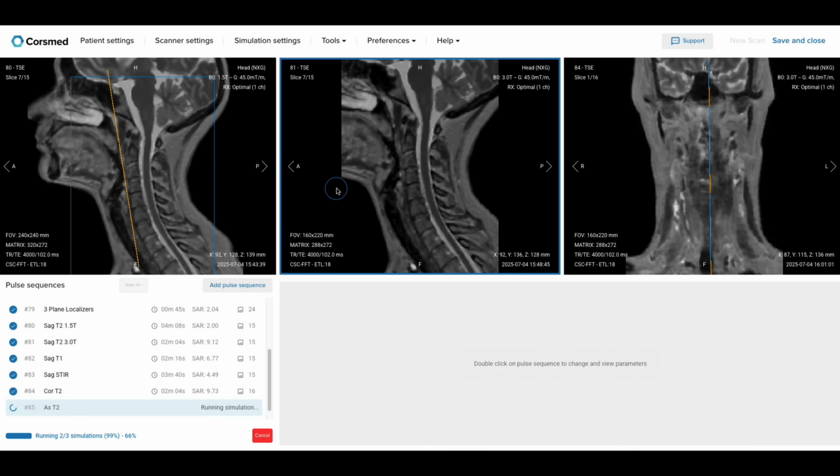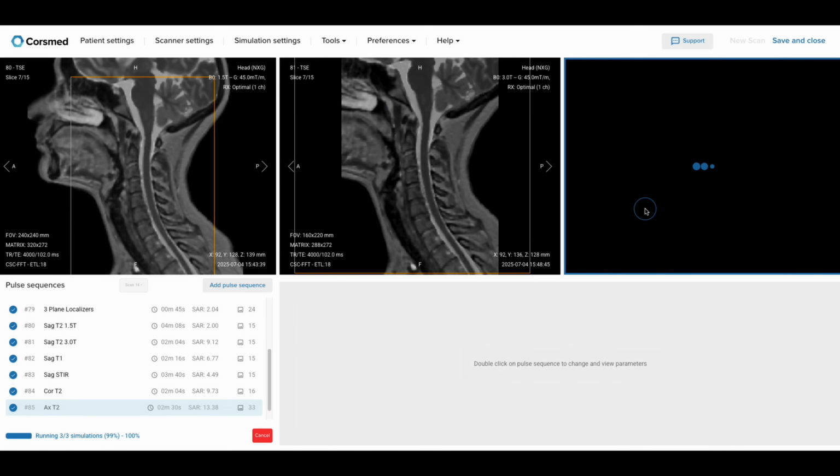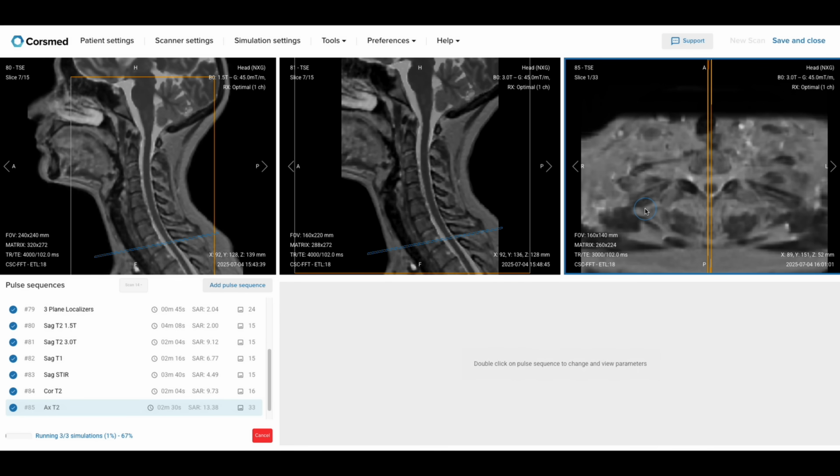Both sequences actually reflect optimal quality for their respective magnetic field strengths. That's important to bear in mind, to always work according to the MRI setting you have available. The image contrast is the same, signal is optimized for each magnetic field strength, and resolution is shown better for the 3 Tesla image.